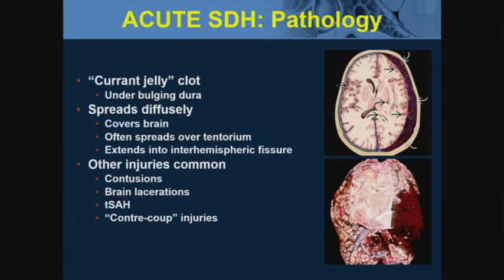We've learned that not all acute epidural hematomas are the same. We want to beware the venous epidurals, particularly the ones that have a fracture crossing the midline at the vertex. We know that the anterior middle fossa epidural hematomas and the clival epidurals we can describe, but they don't really mean anything in terms of requiring surgical intervention.